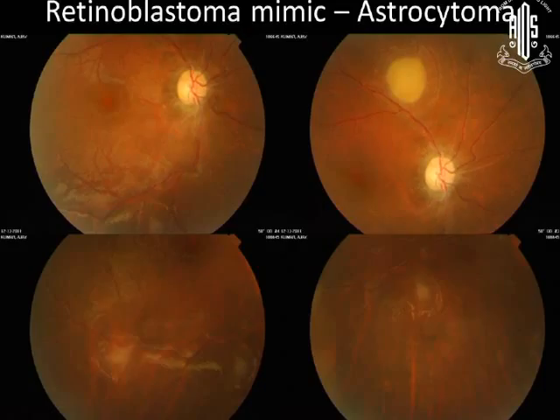So this is a child who presented to us like this. So what do you think this is? Retinoblastoma? Whitish lesion. Child is about 5 years of age. But there is something different, isn't it? In retinoblastoma, we see it to be a little vascular, whitish in color, with calcium. But yeah, something looks very different. There's one more lesion here. So what we are looking at is astrocytoma.